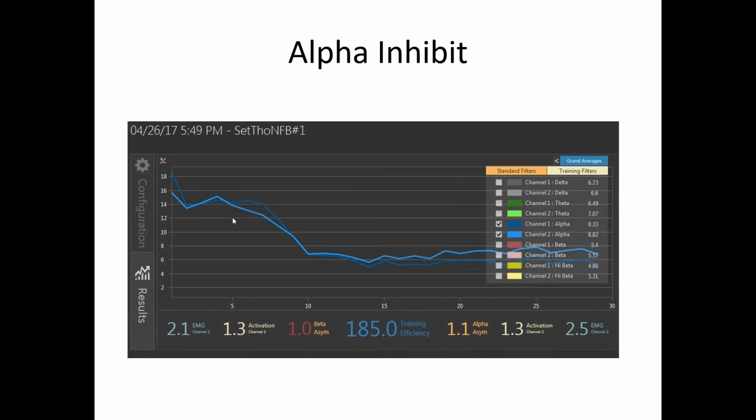Dr. Soutar, yes, could I ask a question about the state changes? For instance, when I have a client who suddenly makes a movement in the chair, and I see those numbers changing. They tend to go up, especially the high beta. I'm also seeing alpha and theta go up, and perhaps even gamma, although I haven't focused on it. Is that what's going on there? Am I looking at subharmonics and harmonics also increasing with the high beta activity? Is that a state of arousal, would you say?